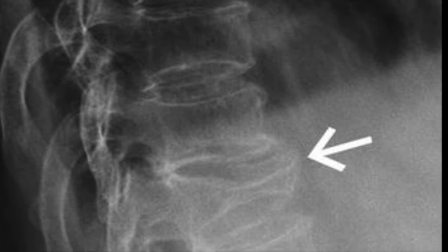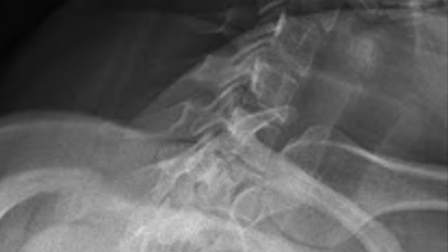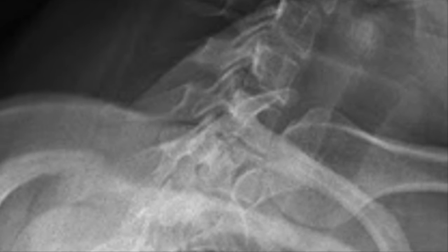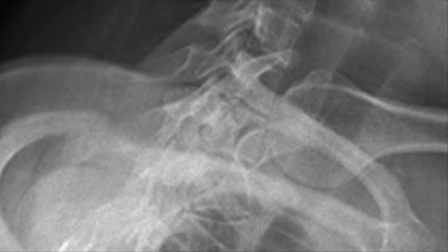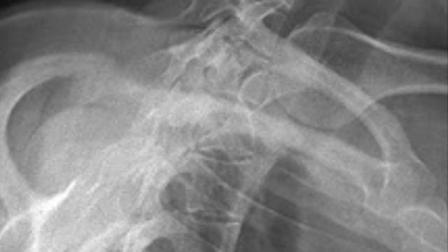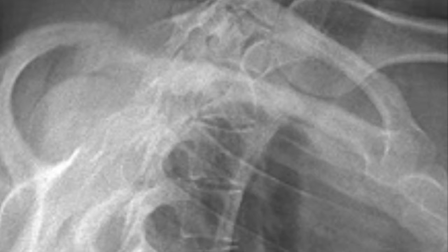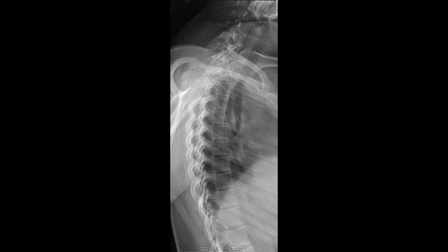For this image of the lateral T-spine, there is slight rotation because you cannot see the intervertebral foramen clearly, and you can see the rotation where the ribs come in through the posterior side. For this swimmer's view, you can see the junction between C7 and T1, and you can also see T2. The radiograph could have been collimated to the 10 by 12 size, but in this case, I think the tech just left the whole thing open just to show that they could get all 12 thoracic vertebrae.